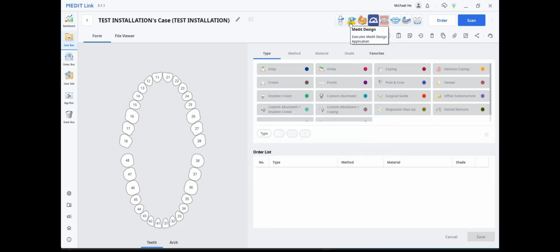You will have now completed the second of the 3 preparatory tasks to start Series 1 course. There are a few other resources you can watch in preparation. Please play around with this program as much as you like. Remember, practice makes perfect.